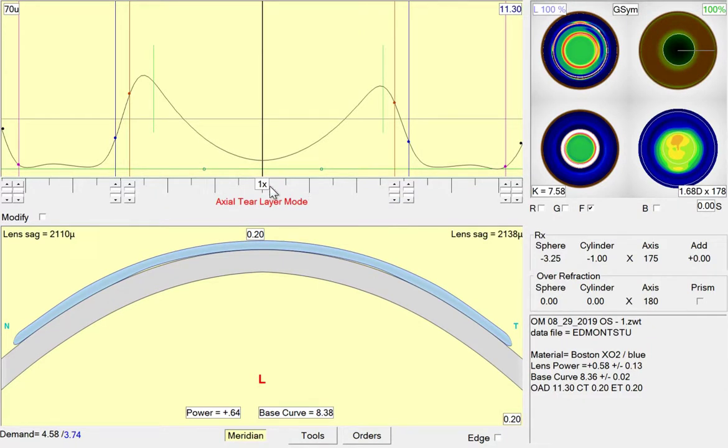And we're getting close. Hopefully your computer is a lot faster than mine. So we're about plus half.